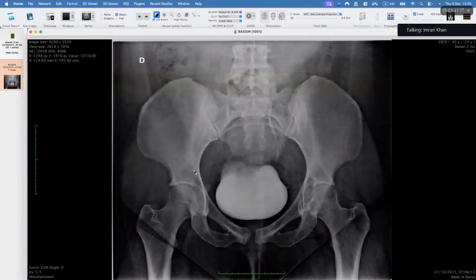Number one, can you point out where you see the lytic lesions in the pubic bones? Now, are you able to see my arrow? No, I can see it moving. Yeah, you can see now? Yeah. These are just projectional. All of these are just projectional. What about any other areas? Yep, these are all just projectional, technical.